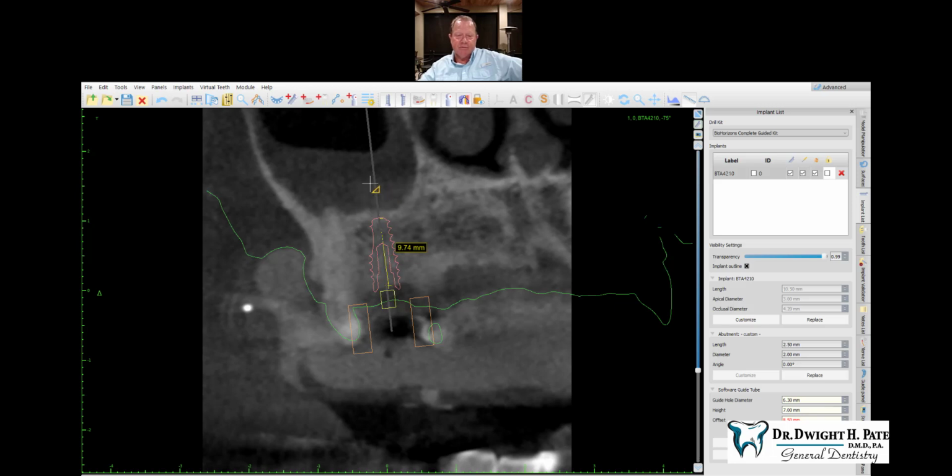Then I would begin to put my bone in to create the bump, and once I had a volume of bone that I needed for the implant, I would insert the implant, and then I would insert the implant down to full crestal distance, down to here. So this is how I would plan a surgical guide for a Versah bump using the C-guides.